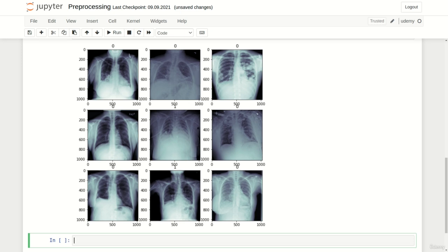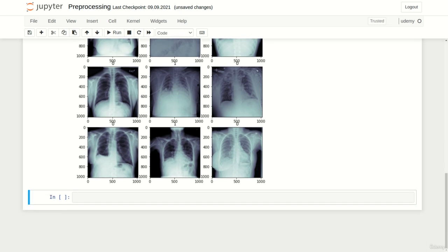Now it is time to actually load and pre-process our data as explained in the previous lecture. We loop over all patient IDs and standardize and resize those images before storing them in their corresponding directory according to their labels. Additionally, we compute mean and standard deviation of those images as explained in the lecture.